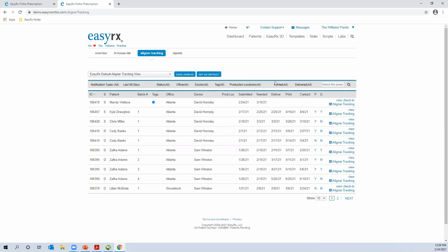A lot of times you work with ULab and they send you a setup and you have 20 upper, 20 lower, but you only want to print 5 and deliver 5, because maybe you don't want to waste resin on printing all 20 or 40 models. There wasn't a really good way to keep track of that, and that's what this dashboard will do for you.